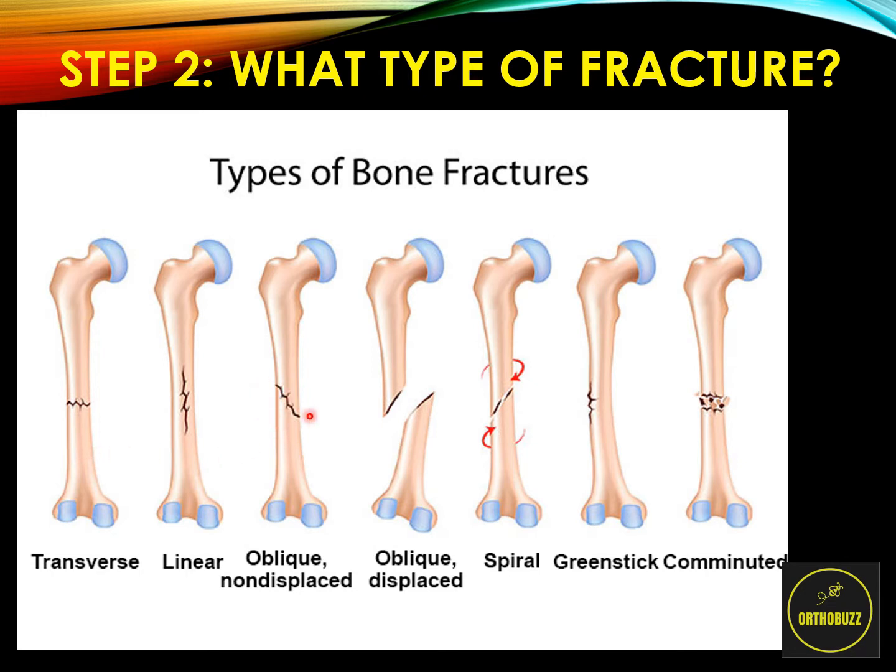The other options are an oblique, which, as the name suggests, is at an angle to the long axis of the long bone. And the oblique fracture can be either short or long oblique. Short oblique, which is shown here, and long oblique, as I'm showing with the cursor, can be a much longer diagonal fracture pattern. The next type of fracture is a spiral fracture, and on a plain film radiograph, which is a 2D image of a 3D structure, it can look very similar to an oblique fracture. But actually, if we looked at it in 3D reconstruction, we would see that it's actually kind of like a helter-skelter pattern rather than a simple oblique fracture.